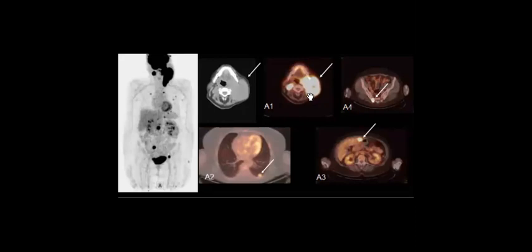This case is late, advanced, but it can come to you early, and you can find a lymph node and very subtle thickening in the oropharynx. Then your advice in this case is to tell your clinician to do endoscopy or oropharyngoscopy for this patient to check if they may have any tumors.